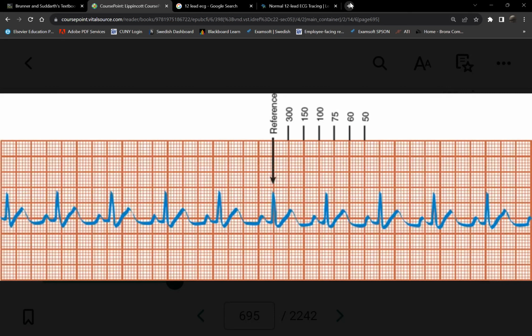Let's say, what about the R wave? Let's see, those 2 R's and then the next 2 R's, are they occurring regularly? Yes, they are. So what can you say about this strip's rhythm? Is it regular? Yeah. It's regular. So can I use any of the 3 methods? Yes. It's going to be a little difficult if the rhythm is irregular.